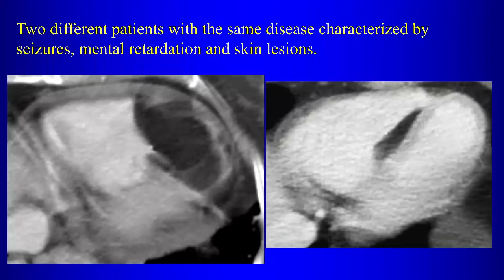So what are these lesions? Notice, no, it's not a fibroma. Look at the attenuation. The attenuation is what? The attenuation is fatty attenuation, right? So if we see a fatty attenuation lesion in the lung, what do we call it? Hamartoma, right.